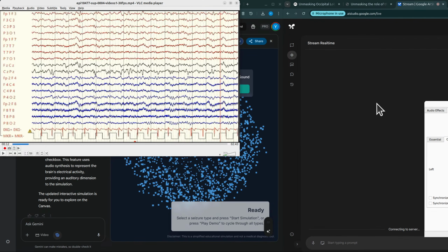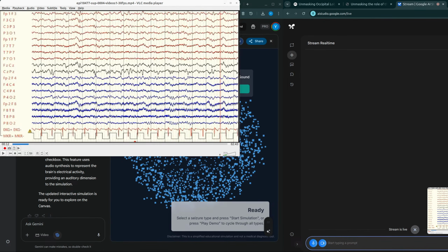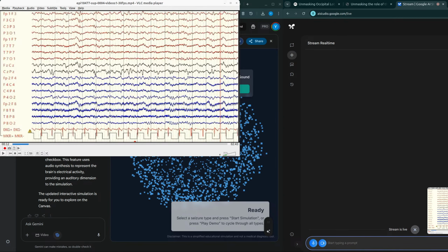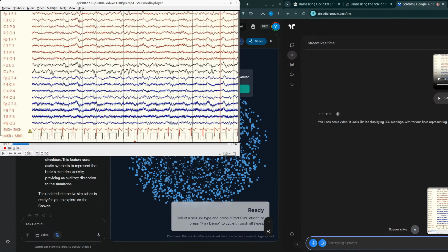Share this video. Okay, can you see the video? Can you see the video on the screen? Yes, I can see a video. It looks like it's displaying EEG readings with various lines representing different brainwave activity.